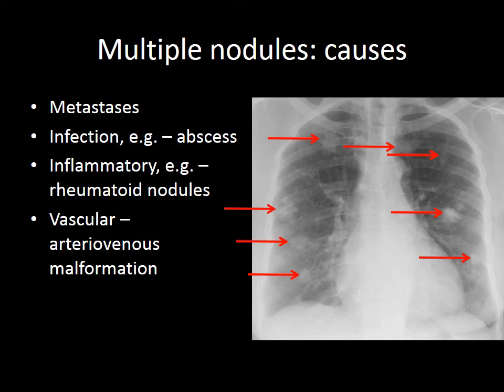Multiple pulmonary nodules have many potential causes. However, the concern primarily is multiple pulmonary metastases.